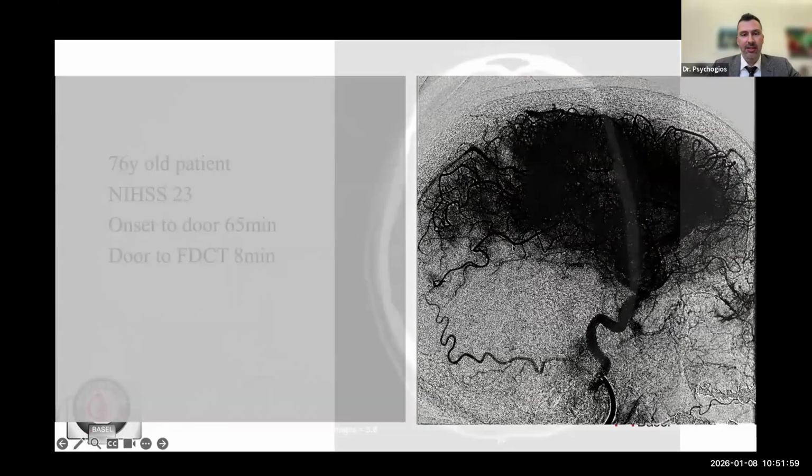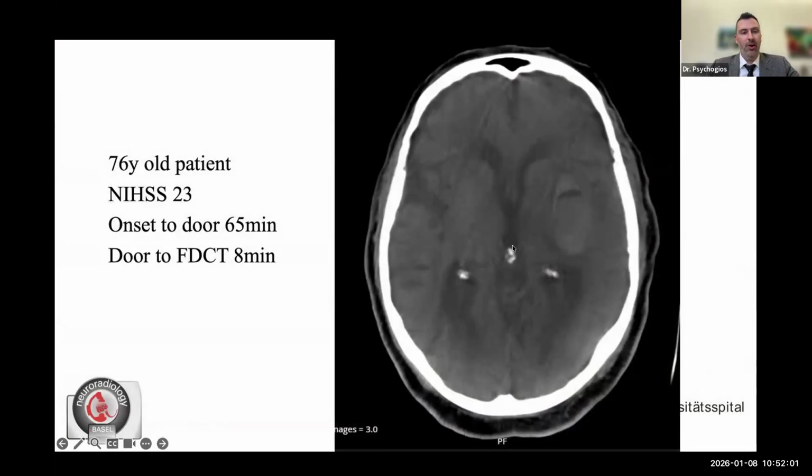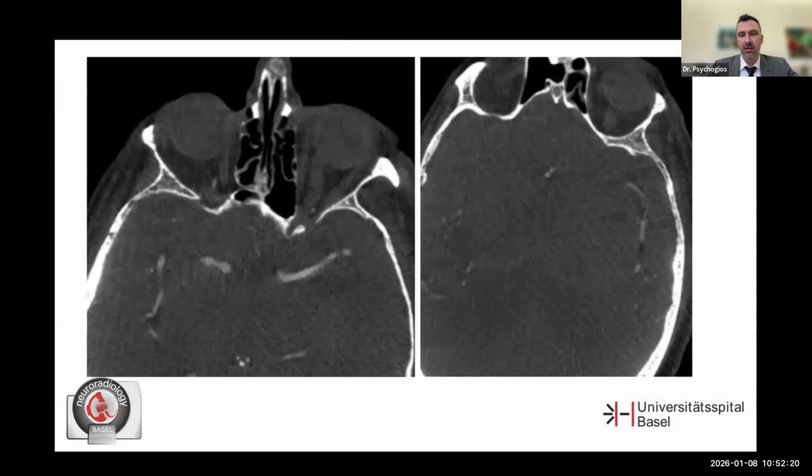And if I have the time, I would like to show you now one case that I think is the first time worldwide that somebody shows this for a flat panel perfusion. So in this case, we actually had a bleeding, right? And again, a big bleeding, you will see it on the flat-panel CT. And usually people, what do they do? Maybe a CTA. Okay, I will show you the CTA images.